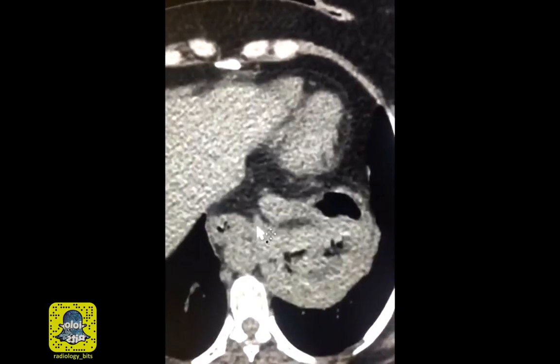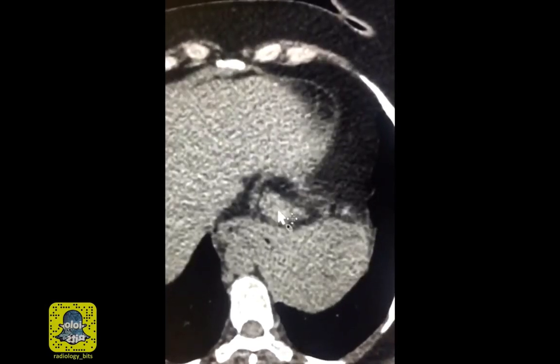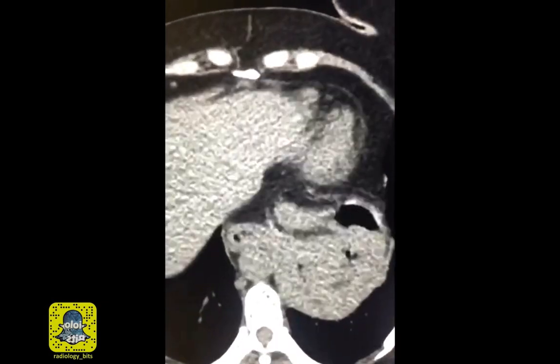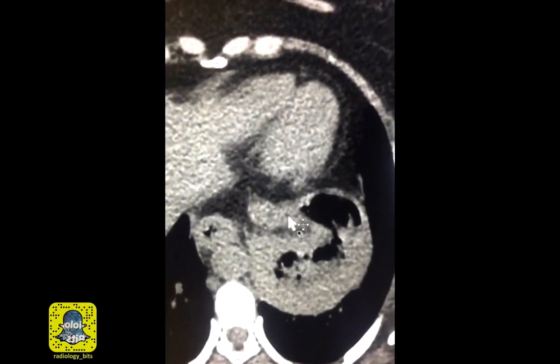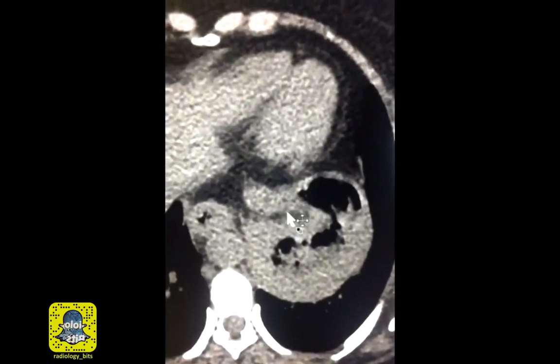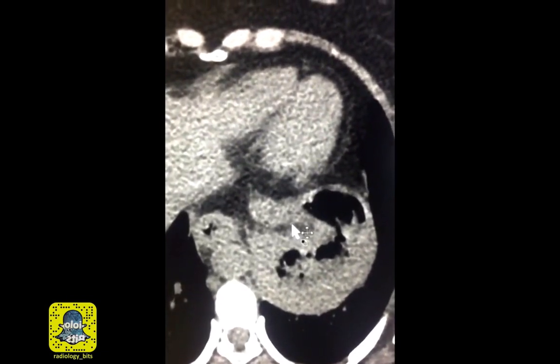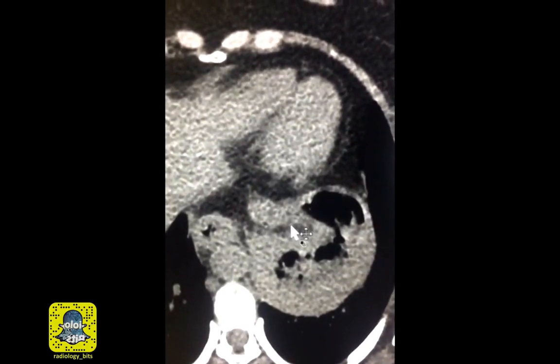You'll also notice that the esophageal hiatus is almost at the same level or even lower than the distal stomach, where part of the gastric fundus has shifted a little bit inferiorly. So that's a hint of things being upside down. Remember, if what's up is down and what's down is up, that goes with rotation along the short axis. And that's what we called a mesenteroaxial rotation.